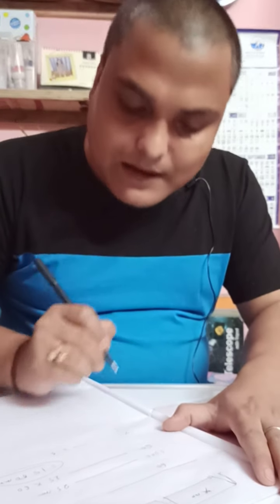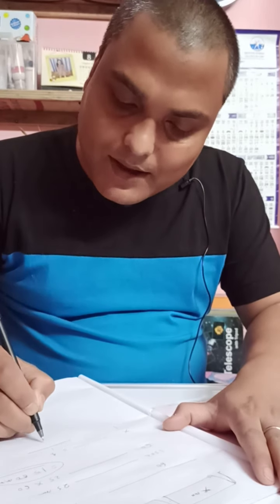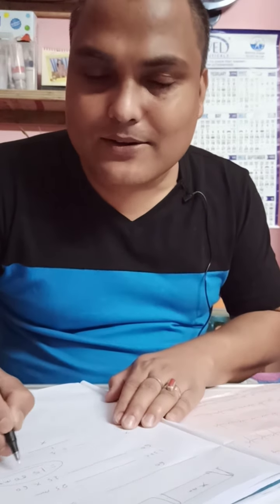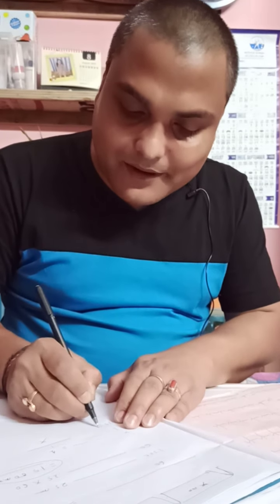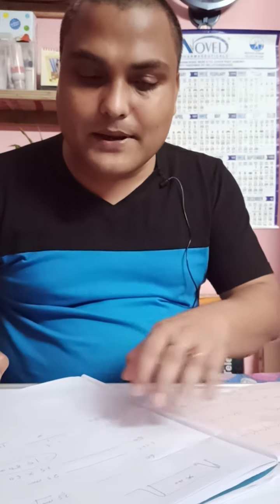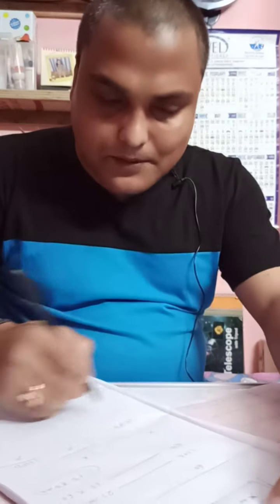So in 1 millimeter interval, heart contraction is coming as 1 by X. And in 1500 millimeter, how many heart contractions will come? 1500 divided by X. So to conclude, how can you calculate the heart rate?